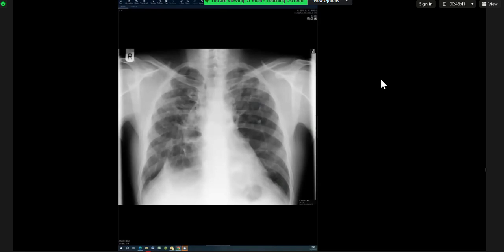Okay. This is a routine clinic chest X-ray of a patient who's come in for follow-up. This is a frontal radiograph of the chest of a mature skeleton. At first instance, I see there's no pneumothorax, pneumomediastinum, or pneumoperitoneum.